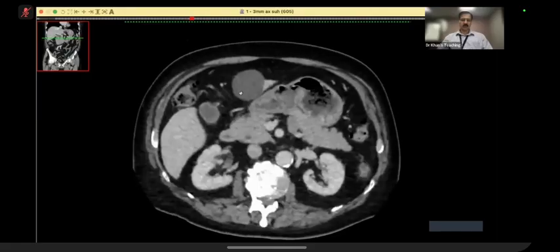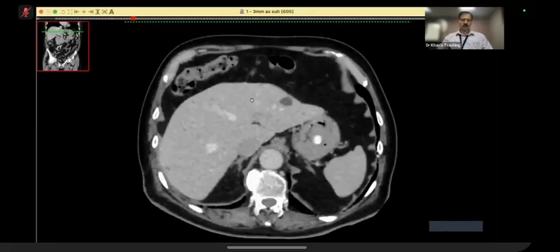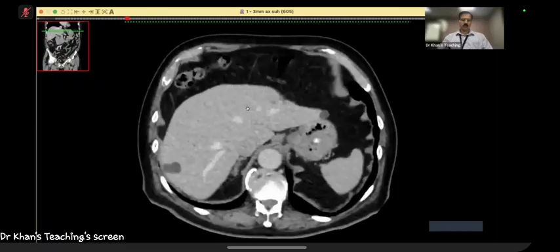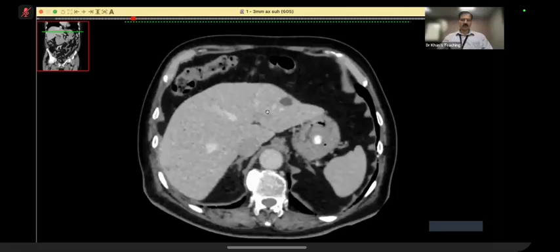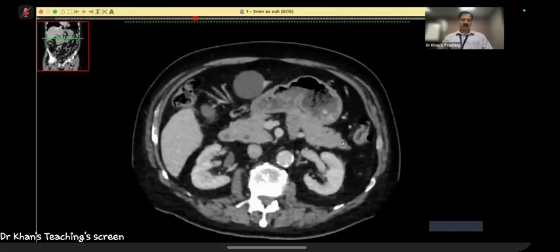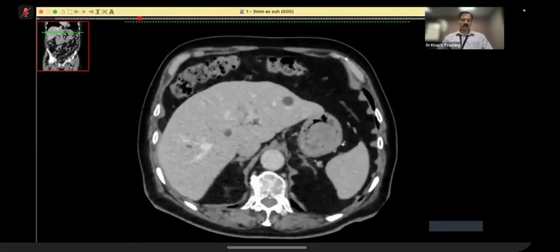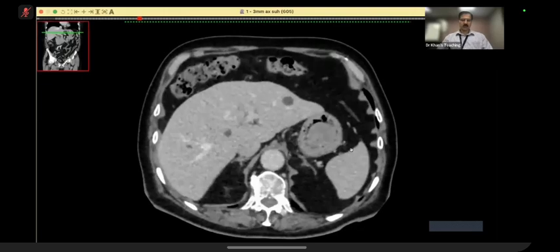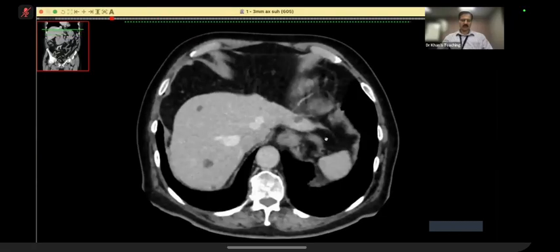If you have got doubt, you should not jump to the conclusion that these are metastasis. You can also say that I can use Hounsfield units, etc. These are all cystic. But it was a satisfaction of search type of case where actually there was a second malignancy. There was a CT scan done for this patient 1 year ago, retrospectively speaking. On that one, this was present but smaller and poorly seen, but here it is definitely seen.